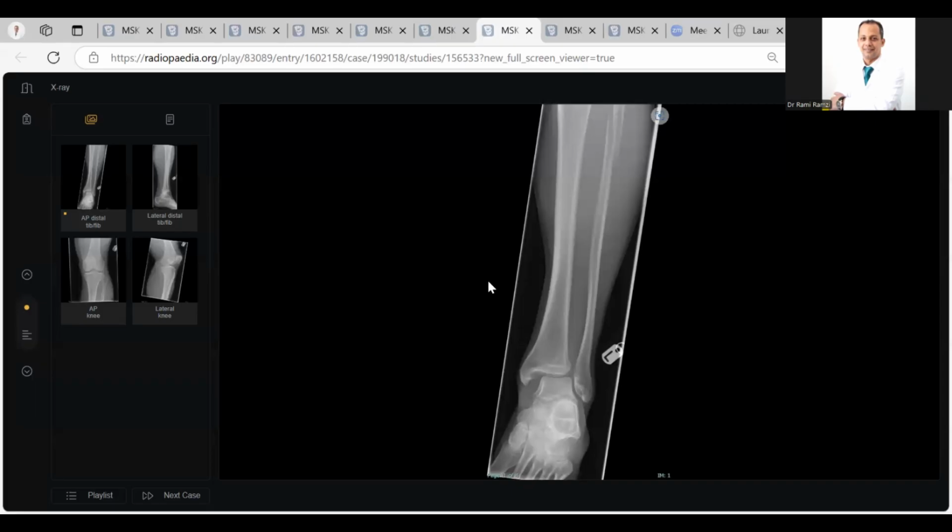Okay, thank you, Doctor. You did very well in the last case. This is Maisonneuve fracture, and by the way, the name is from a French doctor. Maisonneuve fracture is a very common exam case, but he didn't show you this. He just brought one ankle.